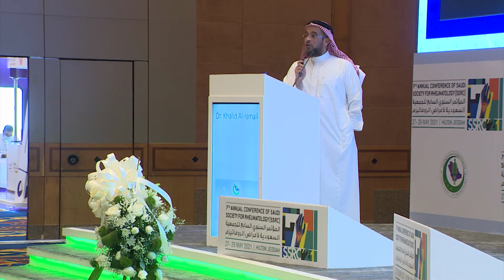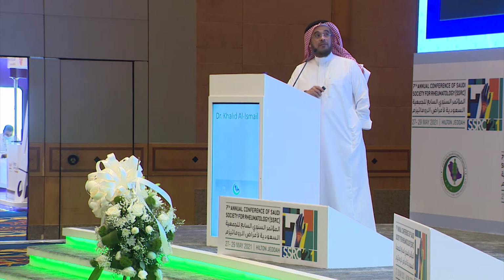Except in those cases where you see more destruction in the bone inside with an element of healing. In sarcomas, you don't see healing. You don't have time to heal. Destruction is continuous. But in infection or low-grade infections, there is time to build up osteoblastic activity, and that's why you will see patchy sclerotic changes. So in this patient, you will see sort of patchy sclerotic changes.